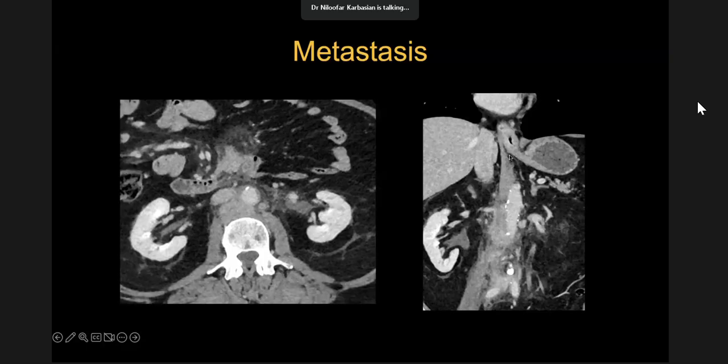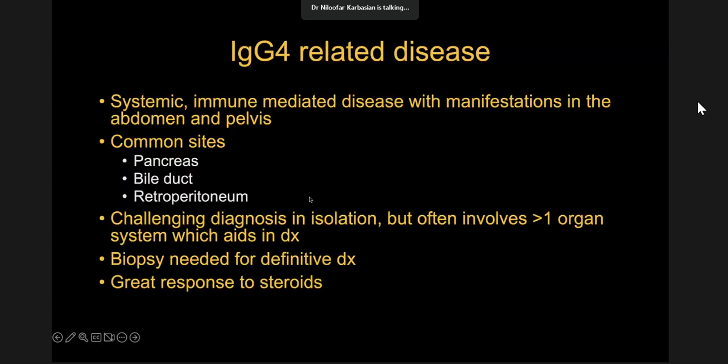But you can see even this sneaky small cancer presented with this super infiltrative retroperitoneal soft tissue encasing the vessels, which was biopsy-proven metastatic adenocarcinoma of the gastroesophageal junction. So never forget this important differential when you see infiltrative soft tissue.